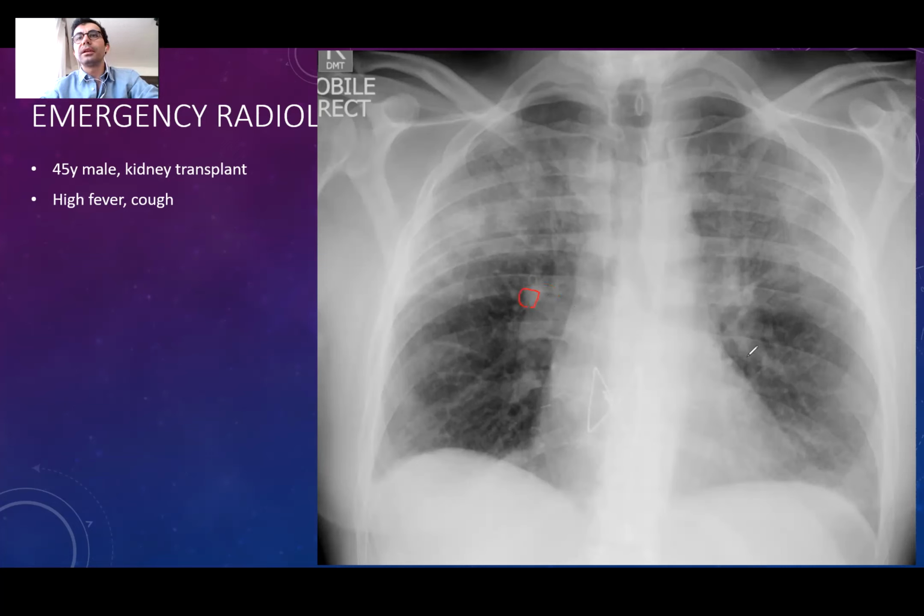Around the hilus, in small areas close to the hilus, we very commonly see nodular densities, which are actually blood vessels. When the blood vessel is going perpendicular to the screen, you can see it as a line, but when it's coming right at you, it makes a nodular density.